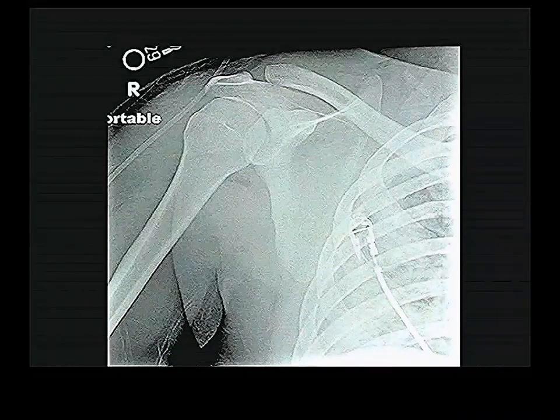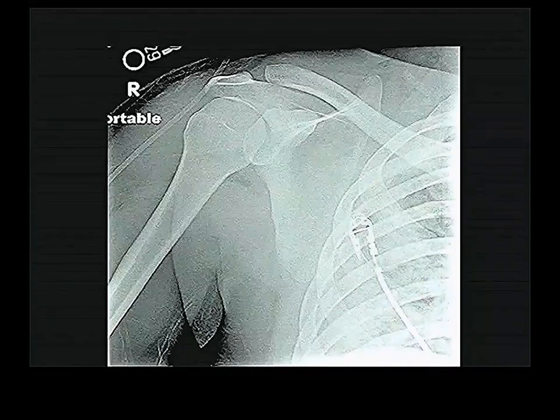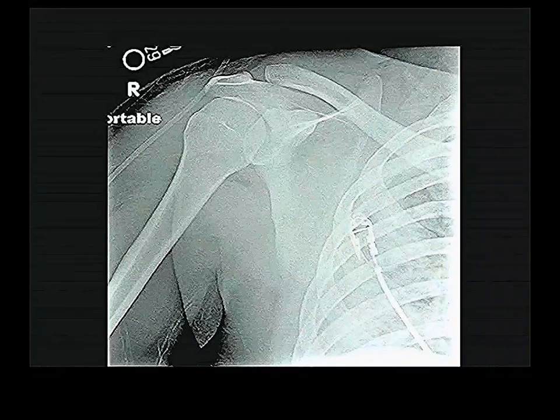So this is a person that's had not a separated shoulder, as Dr. Larson then says she told you, which is a genuine dislocation of this joint with tearing of the ligaments which run from the coracoid, which is right here, up to the clavicle, called coracoclavicular ligaments. And when that happens, the joint is said to be separated, and the clavicle usually elevates because it's not being held down near the coracoid. This person does not have a separation.